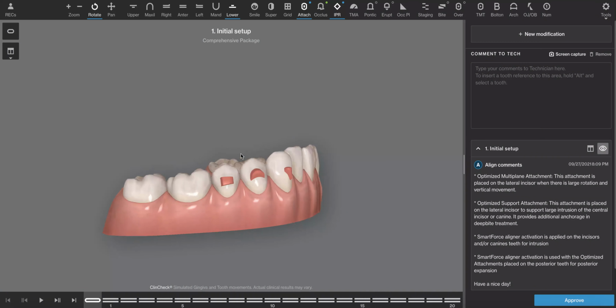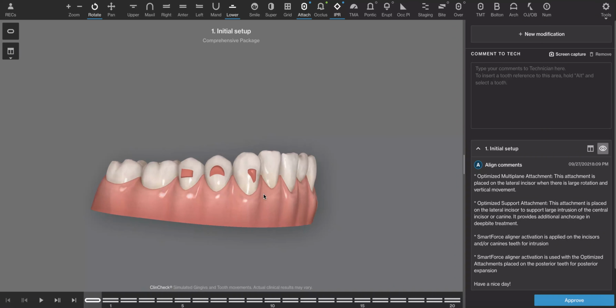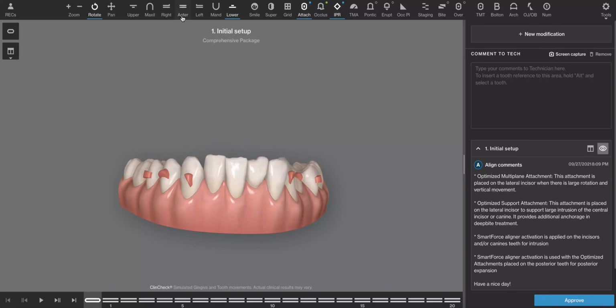If we look from the side, what does it look like? Well, as you straighten the teeth, they're naturally going to intrude. Now, this computer model is saying they are going to intrude. In reality, you're actually going to have less apical migration of the tooth, and it will be more tipping around the center of rotation of the tooth versus the center of rotation progressing apically. If you want to have actual intrusion, what I would do, well, first ask yourself, do you need it?